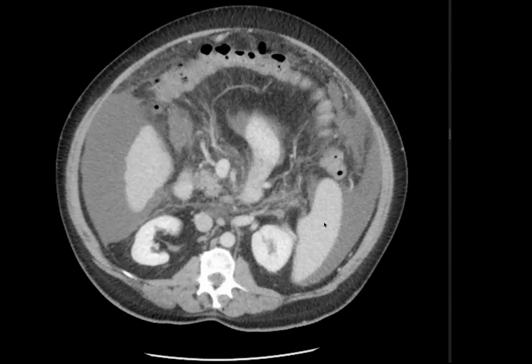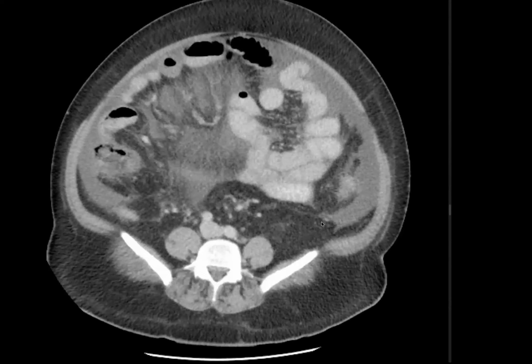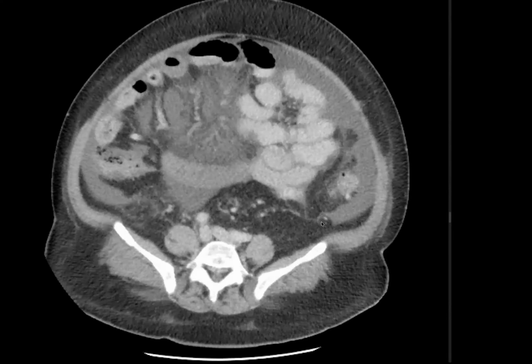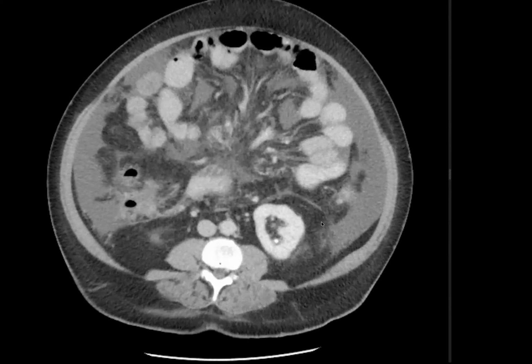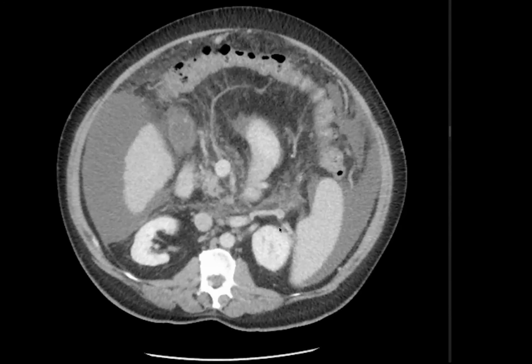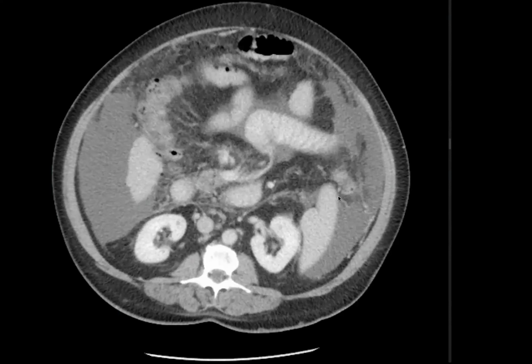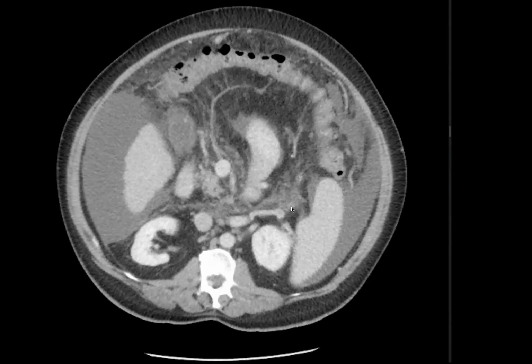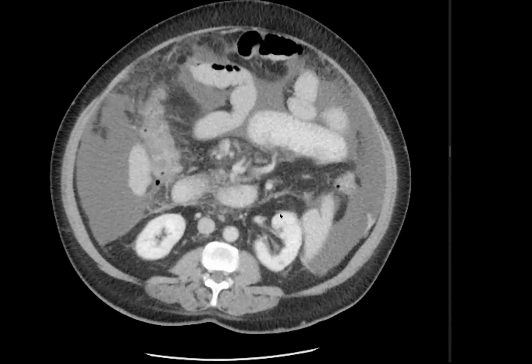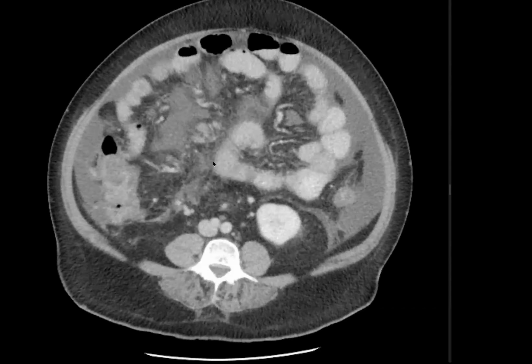There is thickening of the cecum, and there are a few air foci noted surrounding the cecum. I am just confirming them once again. You moved on to the cecum. Did you finish describing the ileum for me? You said the wall appears thickened. Anything else strikes you as abnormal about the ileum? The mesenteric vessels appear prominent. The vasa recta appear prominent.